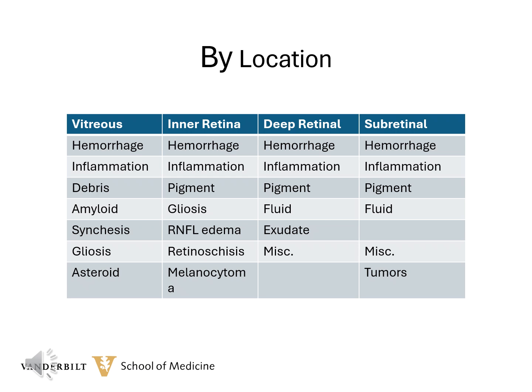However, when we examine a patient or look at a photograph, we start by describing the physical findings such as a hemorrhage, fluid, pigment, or white spots. After we describe what we're seeing, we then go to the location, whether it's preretinal, interretina, outer retina, or subretinal. We would say, I see a hemorrhage covering the major arcades, so it's probably preretinal. Or there's a creamy colored lesion. The retinal vessels pass over it, so it's probably deep in the retina. In general, we do not start with, in the outer retina, I see A, B, or C.